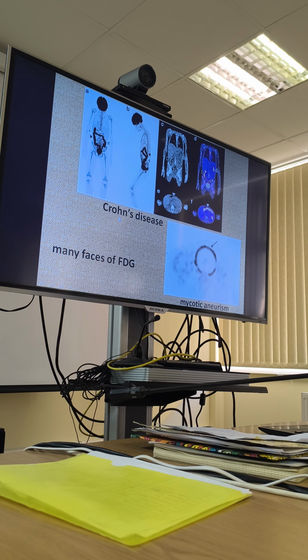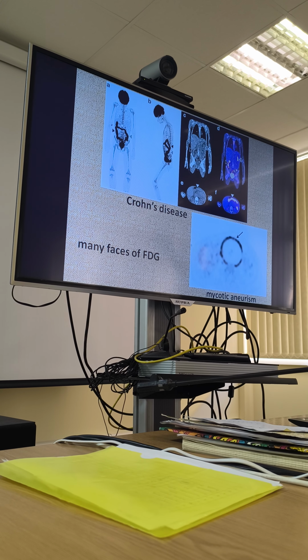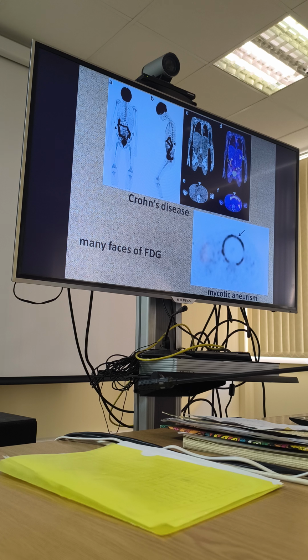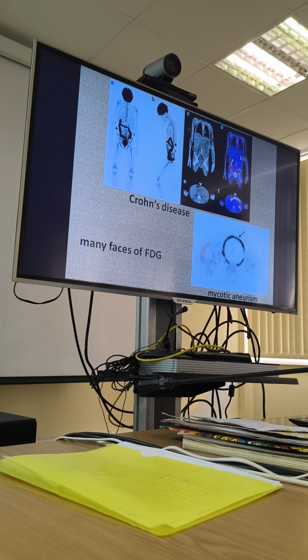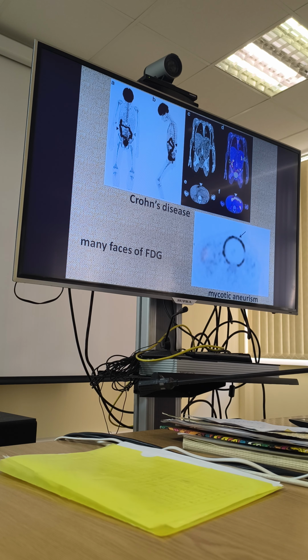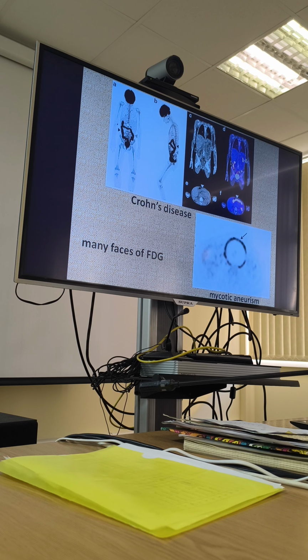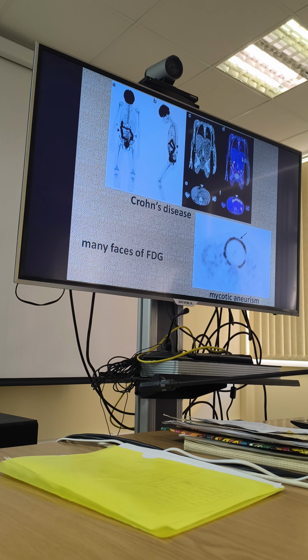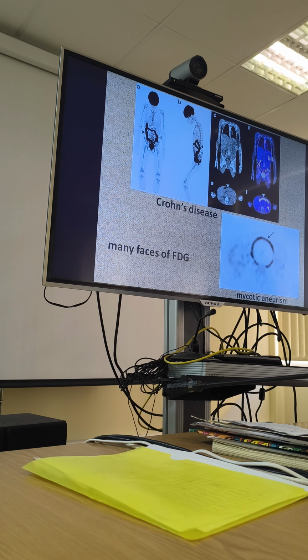And this is a boy who has what we name fever of unknown origin. Do you know this thing? Fever of unknown origin. This is a very complicated clinical situation, where we have to think about many diseases, and there is no local disease. It's really impossible to figure out what's happening. And so in this situation, FDG is really useful in two ways. It can help us to exclude tumor and inflammation. And in this boy, it appeared to be Crohn's disease, because all his intestines are active, and that's the inflammation in this thing, and so it helped to find this.